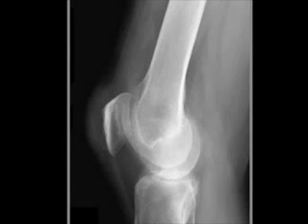Well, the first abnormality is the white arrows pointing to the presence of a suprapatellar effusion, which we did talk about. We didn't talk about the prepatellar bursa, which is also distended and which contains fluid in this patient.